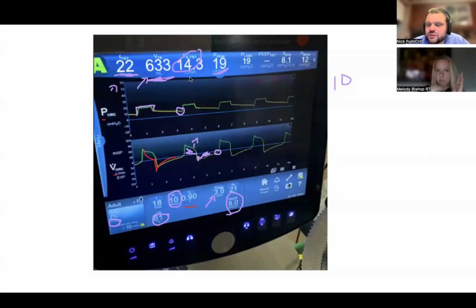Yeah, the idea of trying a higher flow. I would expect that their peak flow would be blunted a bit if they were really spiked, and it's not that high, which is the thing that surprises me. But I do agree with trying that.